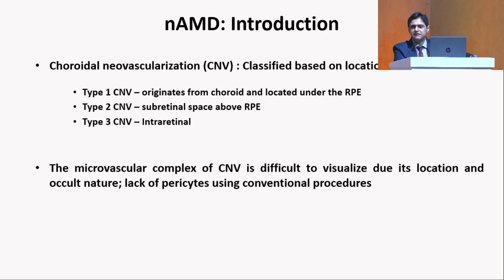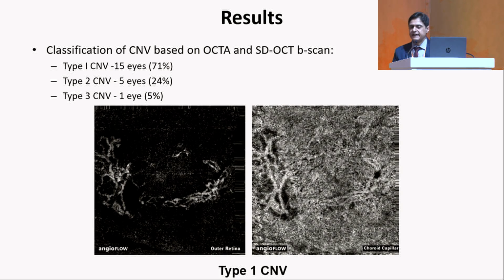Sometimes the detailed examination of the microvascular complex is not visible on an FA or ICG, but with OCTA we can get very detailed segmentation of the superficial capillary, the deep capillary, outer retina, and choriocapillaris, and it's continuously improving, as highlighted in the previous presentation.